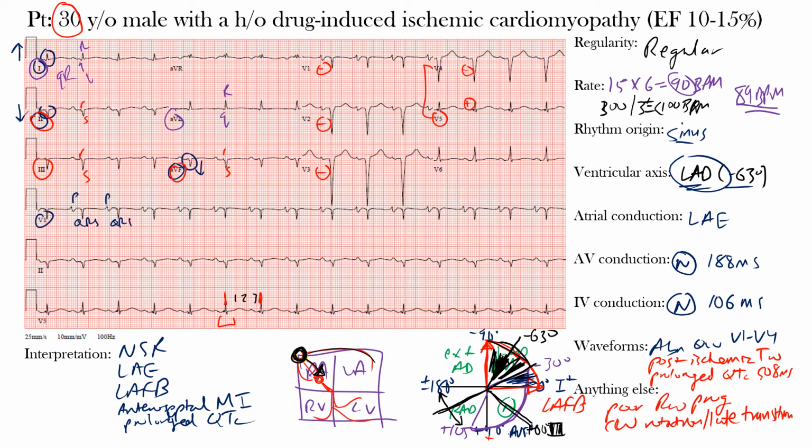QTc interval, okay? And if we looked at the previous EKG, okay, so on the prior EKG, there were no significant changes, okay? So no significant changes on our previous EKG, and you always want to make sure and look back if anything new has occurred.